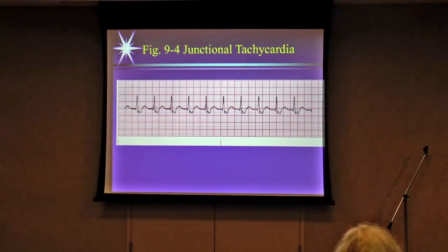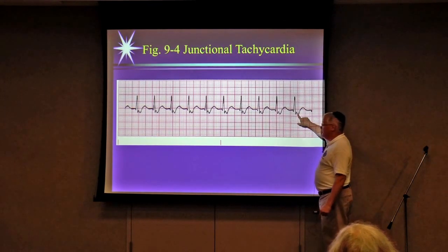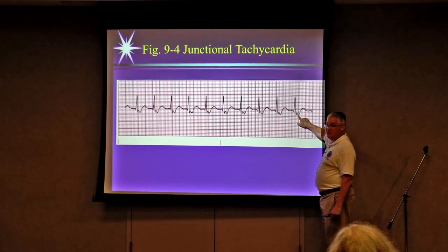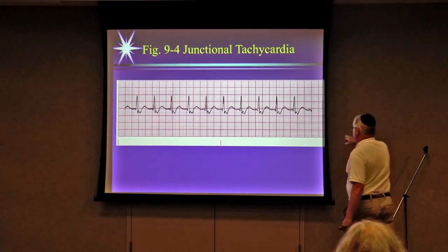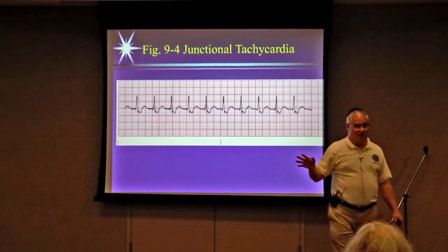Okay, well, I don't know if this is really tachycardia, but let's see. 1, 2, 3, 4, 5, 6, 7, 8. Okay, so they made it exactly at 100. Okay, so here you could see it. Now, the question I would have right off the bat is, is this a P wave after the QRS? Inverted T wave? Well, it's not an inverted T wave, because here's the T wave.